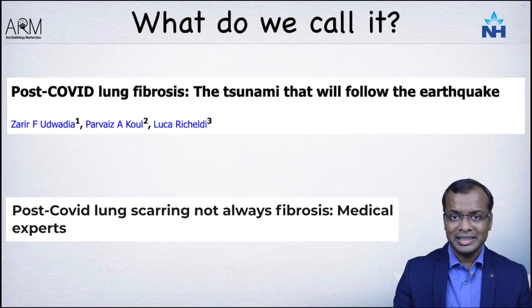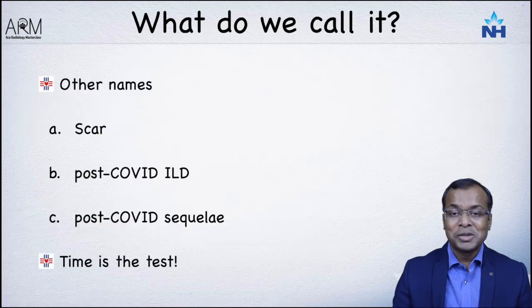On the other hand, some of the observers feel that we can't call all of these things post-COVID fibrosis. They may be just post-COVID sequelae, maybe a scar tissue, but we should be very careful before we start calling these post-COVID fibrosis. So, what do we really call it?